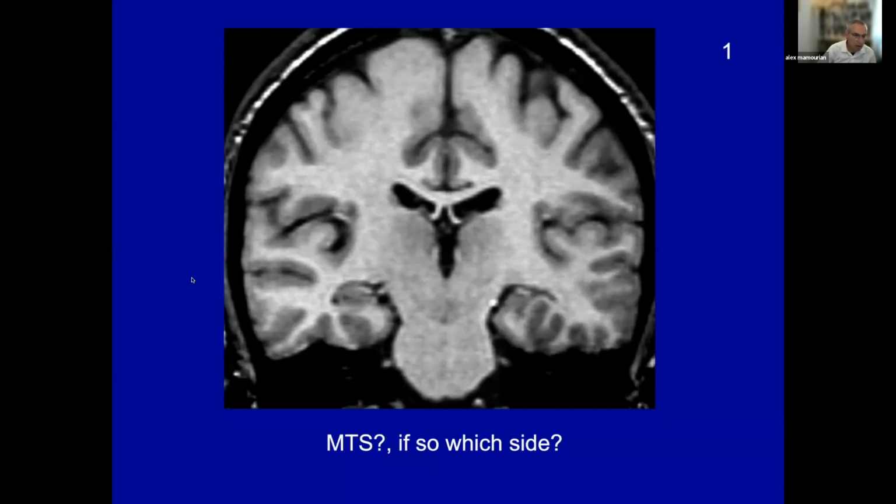Good. Okay, so we're going to end the poll, and we had some disagreement, and so some of that may have been the confusion about the sides. I apologize, but here you can see on the right side the normal hippocampus lying just medial to the temporal horn, and in this side you see no comparable structure. And so this is a patient with hippocampal atrophy. There may be a little atrophy of the fornix. You see the width, the transverse dimension of the fornix on the left side and the right side. So again, this would be a supportive finding, but the primary finding is the loss of structure here.